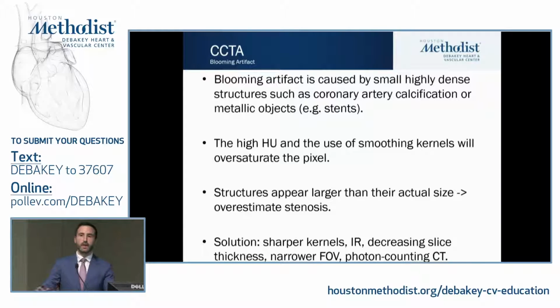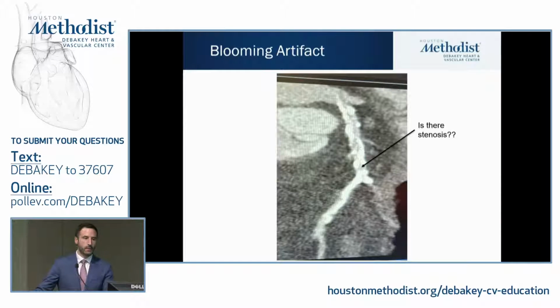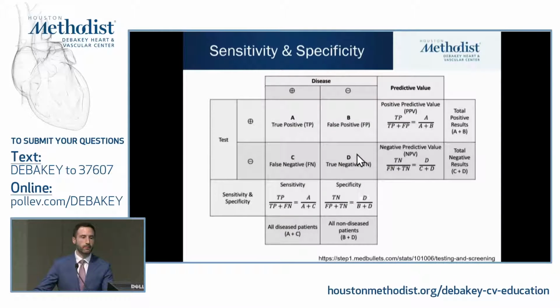But even after all that, I think it's still sometimes challenging to really know whether or not there is stenosis. And so other testing besides CT is commonly done. And so just to illustrate again, a lot of calcification here in this LAD and into the diag. And, is there stenosis? Maybe, maybe not, but we want to be a little bit more certain.